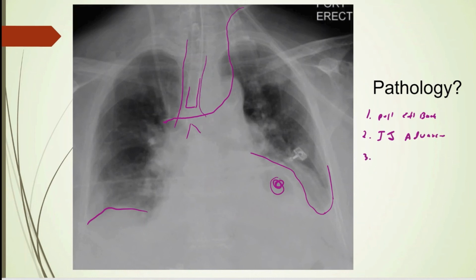And then three, you've got to wonder about this left lung. Is it due to poor expansion? Like maybe that endotracheal tube, even though it looks okay, might be down a little bit, because it's kind of borderline. Might be a little bit right mainstem. Or is there a consolidation or process going on down here? With this gastric bubble, and I'm pretty sure that's a gastric bubble, up high, first on my differential would be pull this ET tube back some and repeat that chest x-ray in a bit and see if that corrected it. That would be my first thought. But again, sometimes this goes into a radiologist helping you out, and this may be just one of those times. A really interesting chest x-ray, though.